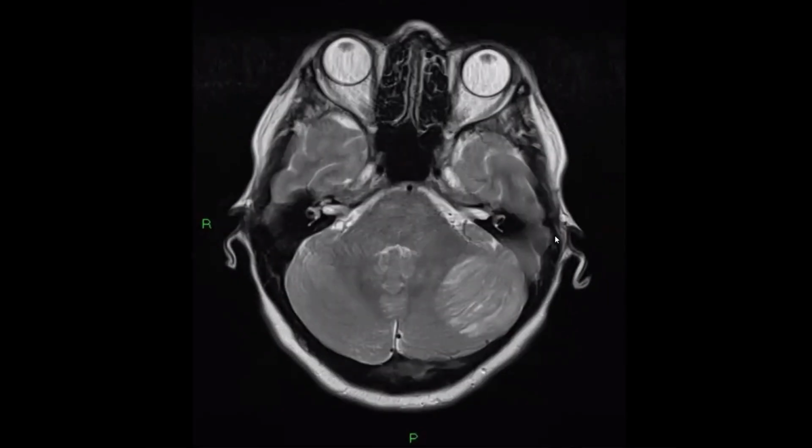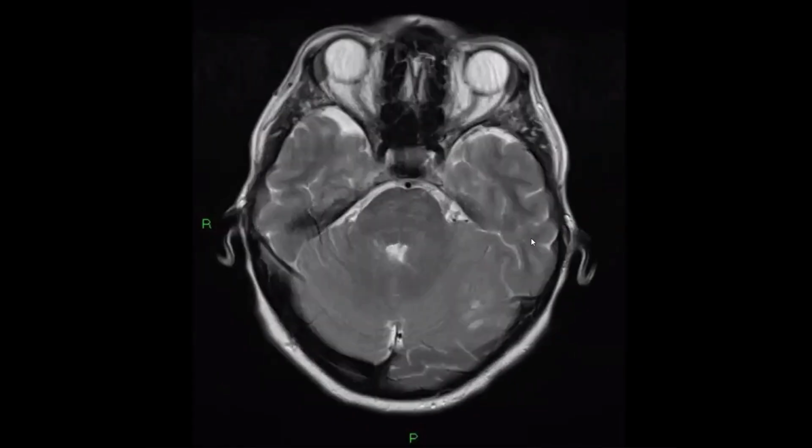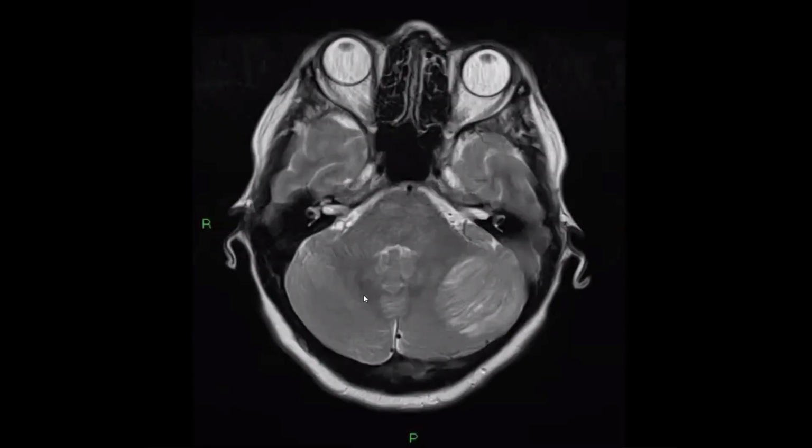Wow, very nice. You got the diagnosis straightforward. We have dysplastic cerebellar gangliocytoma. Yes. How did you identify this mass lesion? What are its characteristic signs? It has a characteristic appearance. It has a tigroid pattern of alternating hypo- and hypersignal, or striated pattern. Striated pattern. Yes, it's very characteristic. What else? No mass effect and no surrounding edema. Yes. And the cerebellum is a typical site.